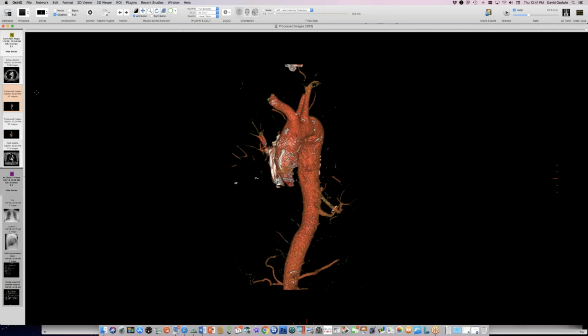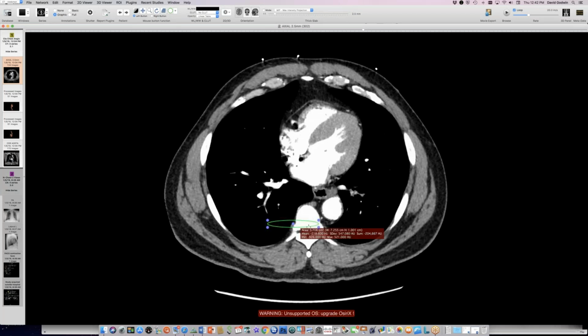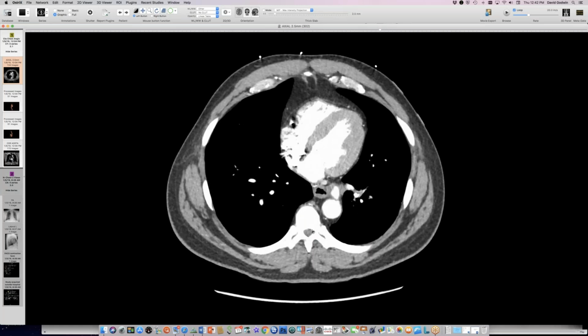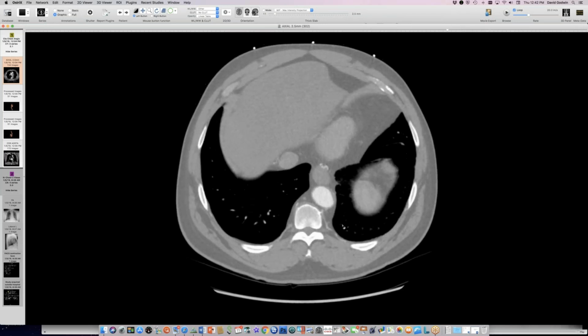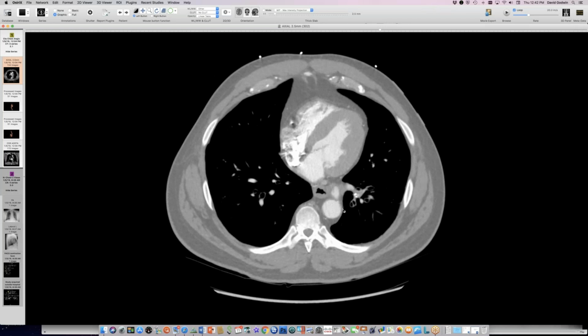If you bring it up again one more time, David, I wanted to see if I could see any mural calcifications at the origin of that vessel, close to where it originates from the aorta. Is there any mural calcification in it anywhere? I think you had a non-contrast. Yeah, there was a little dot of calcium at the origin right here.